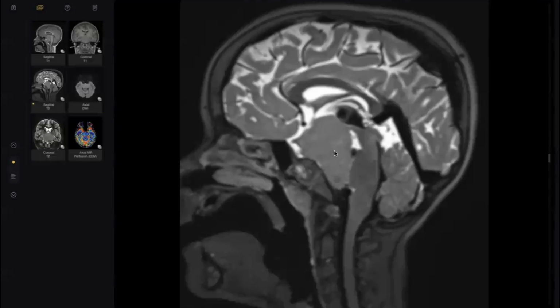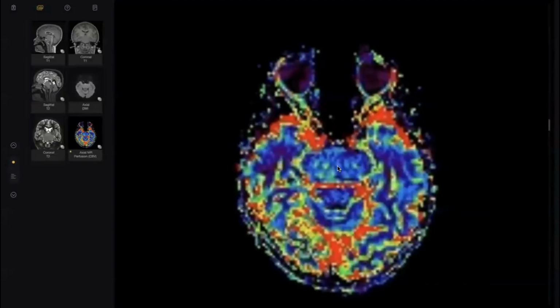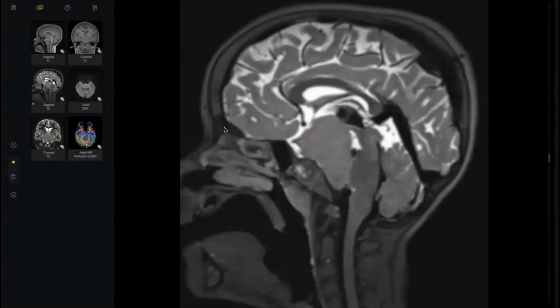Otherwise, you can say this is a suprasellar mass for differential diagnosis, like you told me craniopharyngioma. It must be at the bottom of your list, but no problem. Then what else? Tell me two or three. Glioma, for example. But doctor, this looks hypovascular or isovascular to the white matter. According to the age and the complaint, it may be hypothalamic hamartoma.